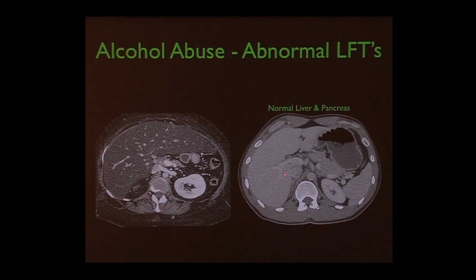Let me find my pointer. Liver here. Pancreas is here. Stomach with fluid and gas. Left kidney, we're a little bit above the right kidney. And this is the spleen. Let me find my pointer again. Right there's the spleen. So this is the normal thickness of the pancreas.